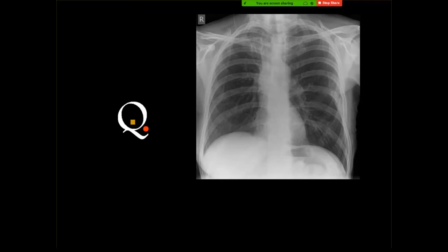Hemomediastinum. Normal. Right hilar shadow. Deep sulcus sign of the left costophrenic angle. No. Normal. I think there is some malposition. Normal. Yes. Look at the breast shadow.